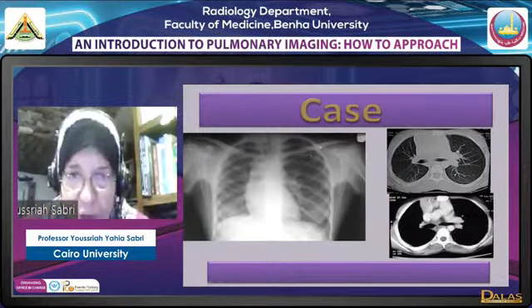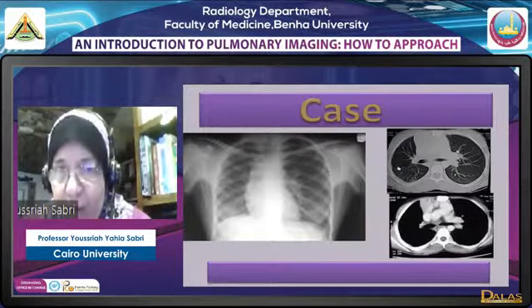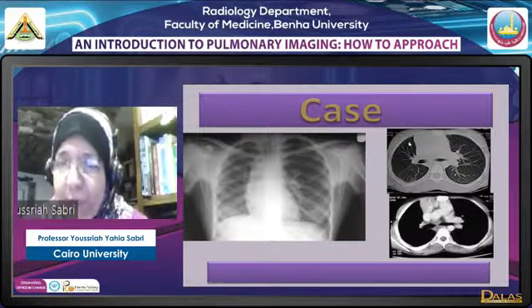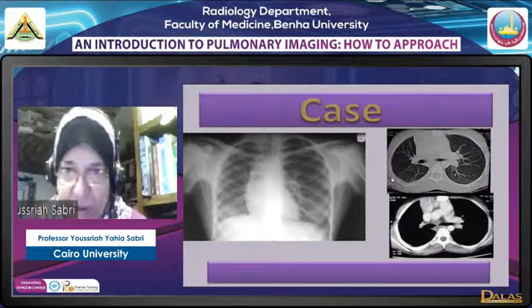In this one, which is a child actually, you can see the epiphyses here. Okay, now, is this lung only small or is it hypovascular? Well, compare the vessels in the axial images on both sides. You will find that the lung is small and hypovascular, and actually there are some abnormal vessels posteriorly.